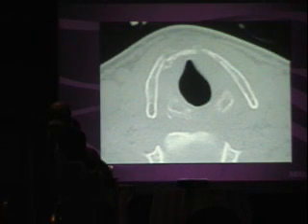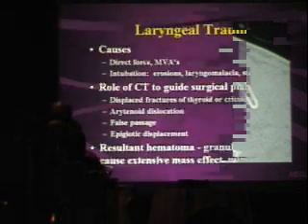Okay? This next thing I'm going to show may seem very obvious, but the reason I show it is that it's been known to show up in certain hotel rooms in Kentucky. And almost every year, one of our residents sees one of these. It's just laryngeal trauma. But it's important to always look very carefully for cartilage fractures. Because if you don't treat this, not only can it hurt the voice later on and get very difficult to repair, but it could blow up into a big, almost chondrosarcoma-looking exuberant reaction. And you wouldn't be able to tell it from a tumor because it could mimic a tumor.